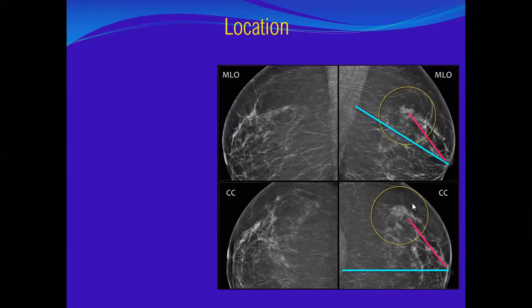Go here to 1, so where it will be 2 and 3. This one is 2 o'clock, Dr. Rabab. 2, not 1, sorry. Upper outer 2 o'clock and the depth, the middle. And still you did not say the left. First thing I mentioned, this is left. Okay, so it is left upper outer at 2 o'clock, middle third, then the distance from the nipple.